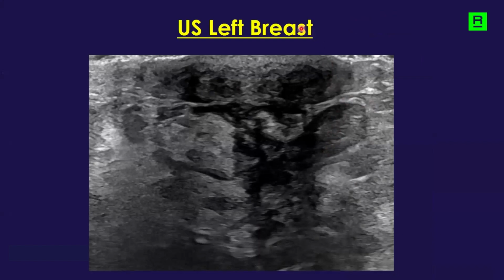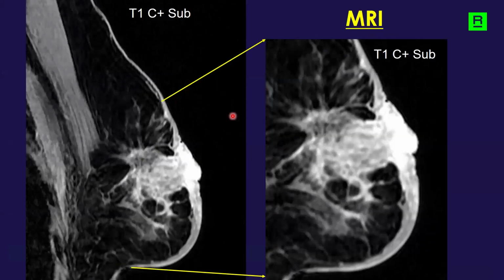Patient underwent an ultrasound. There was thickening of that nipple areolar complex, a little heterogeneous in appearance. Also, there was this heterogeneous non-mass region on ultrasound in that subareolar region. On MRI, here's the T1 post-contrast subtracted image in a sagittal projection. We can see, in a large image of this view here, that enlarged nipple with skin thickening and all this abnormal enhancement of the skin.